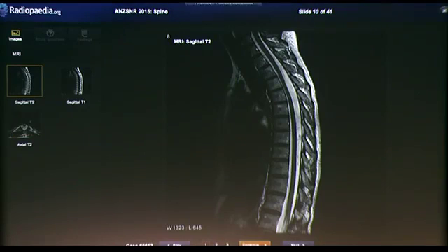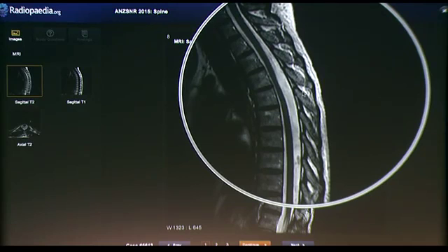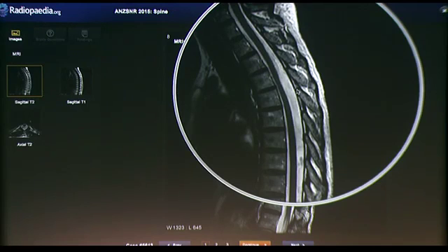So I'm just going to contrast that to this case, which is similar to our previous two cases where we've got anterior displacement of the cord and an enlarged posterior CSF space. Like the case immediately preceding, there's preservation of the anterior CSF in front of the cord, so it's not going to be a ventral herniation. The shape of that indentation really doesn't look like that scalpel sign from the dorsal arachnoid web. And there's no syringomyelia. What we do have that's a useful finding is this.